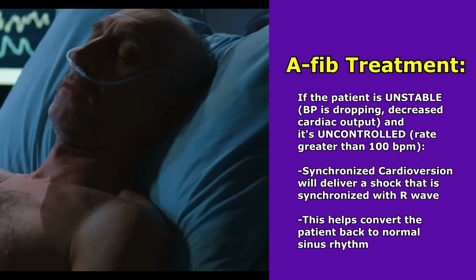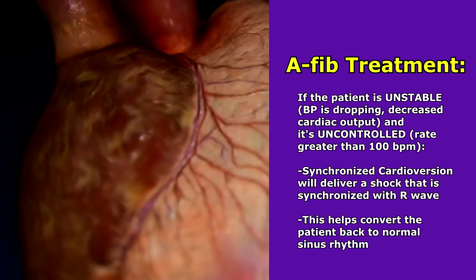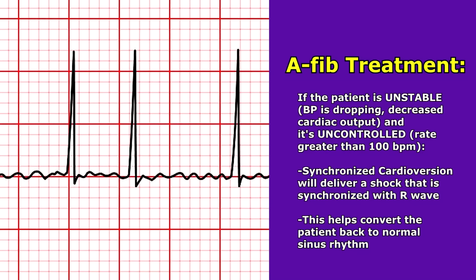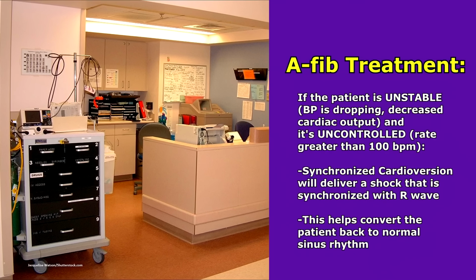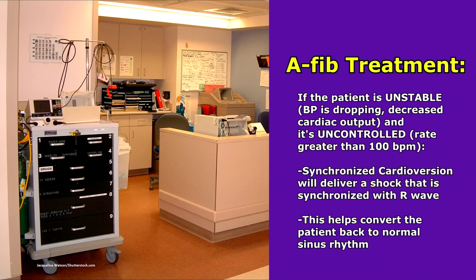But let's say that the patient is unstable. Their blood pressure is dropping, they have decreased cardiac output. You can tell that this heart is just not able to maintain perfusion. Plus, they have an uncontrolled rate. Well, they're going to need a procedure called a synchronized cardioversion. And with a cardioversion, it's going to deliver a shock synchronized with the patient's R wave and convert them back to normal sinus rhythm.